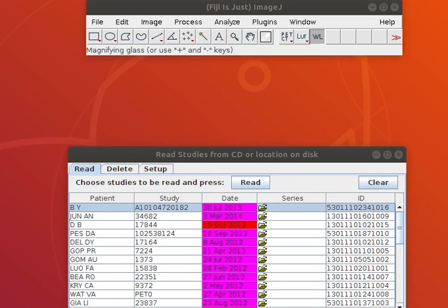I would like to make a demo of the original method of Beth Israel to generate reports to the referring physician. The reports would include not only the text, but significant images plus an image of the rotating MIP.